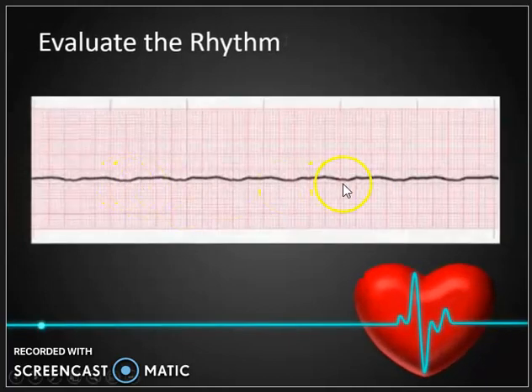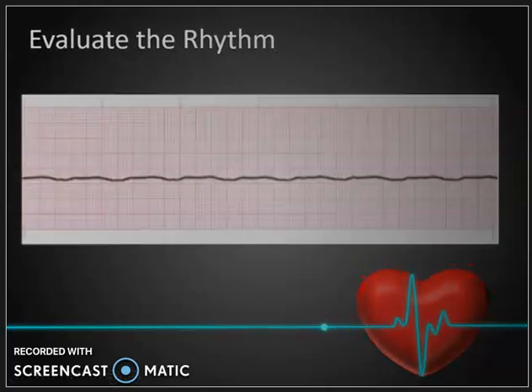Alright, so here we don't have anything to evaluate. There's nothing there. So that's asystole.